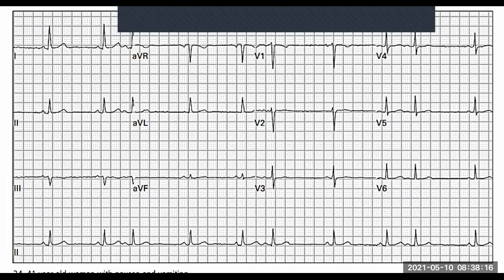In technical terms, even your machine would work out this one to this one, the two closest peaks. If we had to work it out, we had about 1, 2, so about 100 is the maximum heart rate. So it's not really a massive tachycardia. This is not a rate problem. This is a rhythm problem from what we can see. But nevertheless, that doesn't mean we shouldn't look through the rest of the ECG.